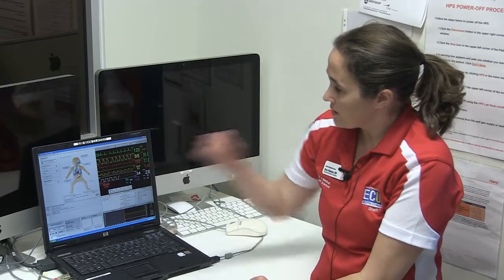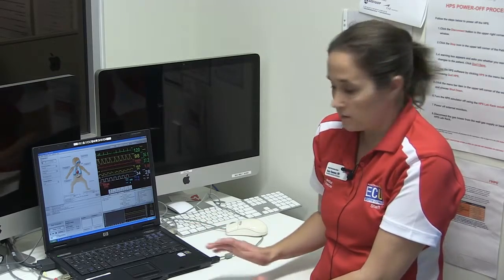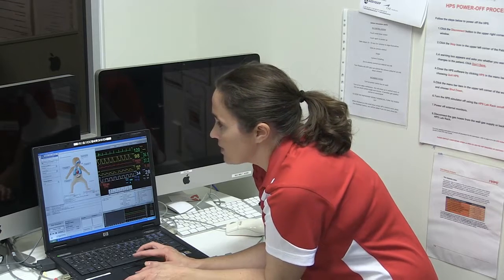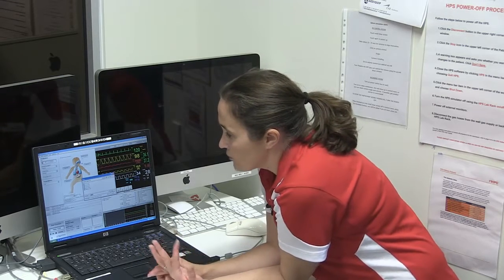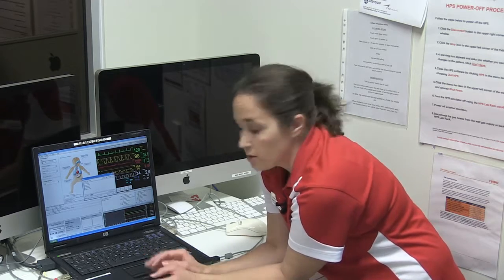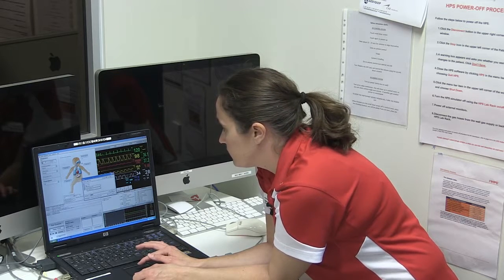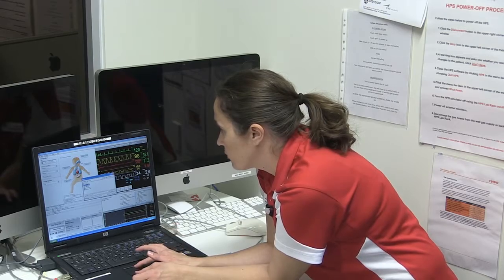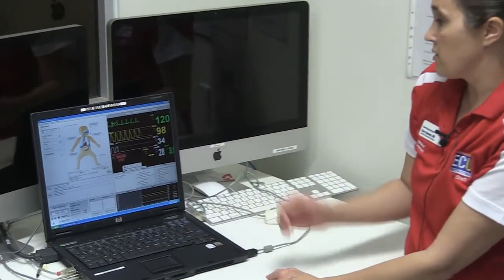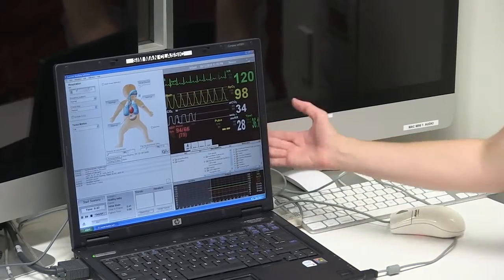You see chest rise. Now, if you want to change the patient monitor look, you go up to View. The first one is Select Patient Monitor. You get 3 waveforms, 4 waveforms, 5 waveforms, big numbers. You can also program your own monitors in there as well. Say we don't need an invasive arterial blood pressure. We'll go to 3 wave, click OK. That gives us the heart rate, the saturation, end tidal, non-invasive blood pressure, respirations, temps.